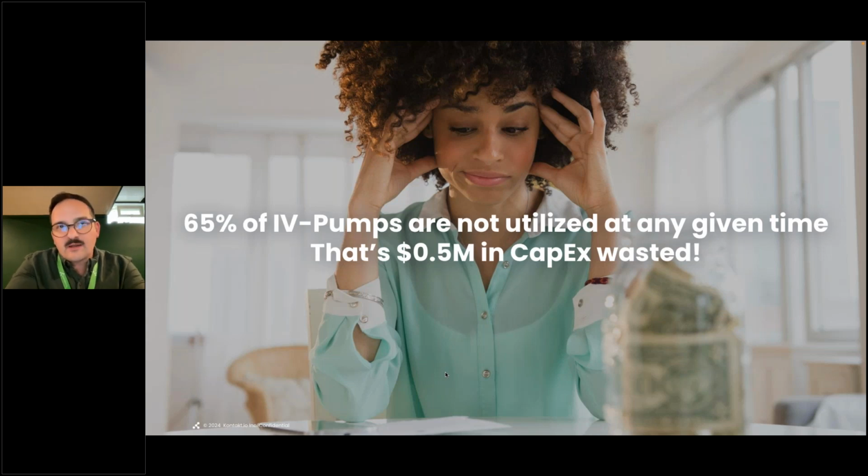IV pumps we talk about a lot because, for one, they're very expensive, and you've got a lot of them typically. And what we're seeing across the US right now is that 65% of IV pump fleets are not being utilized. They are sitting unneeded in a closet that somebody hoarded at one time and then forgot they were there. And this is almost $500,000 in CapEx just wasted by things sitting around and not being used. So 30 to 40%, I think, is our average for things that are actually utilized.